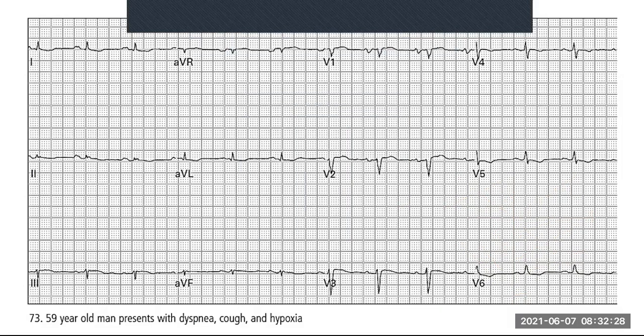All right. So we know that. Now let's look at the rhythm. The first thing we're going to have a look at is the P waves. So let's have a look at our P waves. First of all, where can we see P waves? Let's look for them. Not really. Maybe one or two there, one there. This looks like an odd one there. But all right, let's look at it. Here we've got the most normal looking P waves in lead 3.